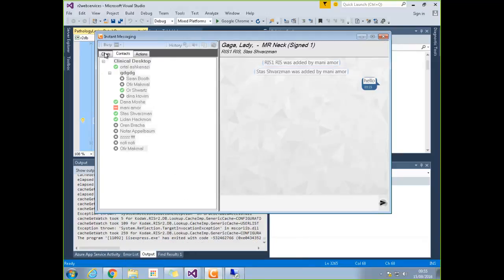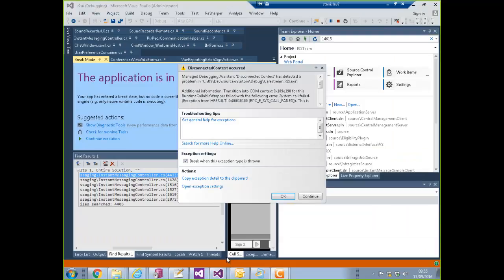This is why we don't like it. So when you start it, you just need to create it and edit it. I have people that are no longer in the company, so it's deleted. It's your manual list which you build. Yeah, so it is cumbersome. You don't need it. You have the search button of all RIS users.